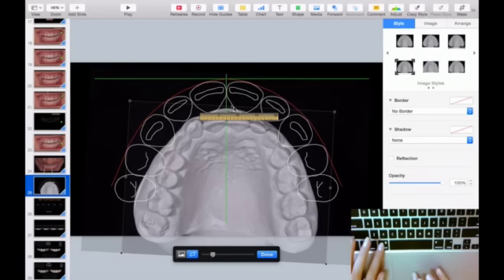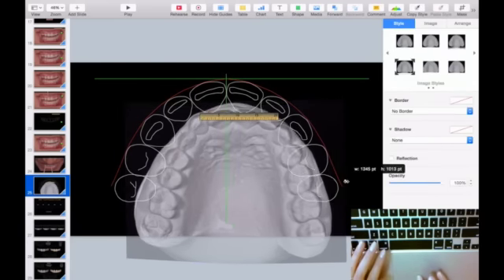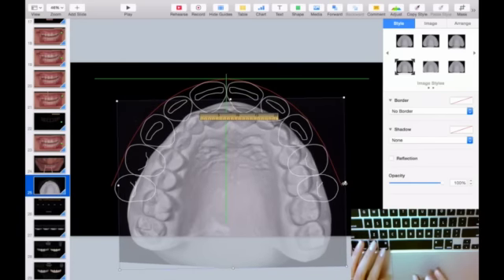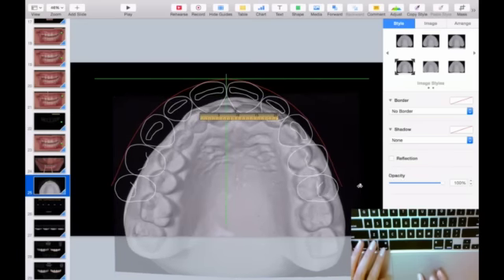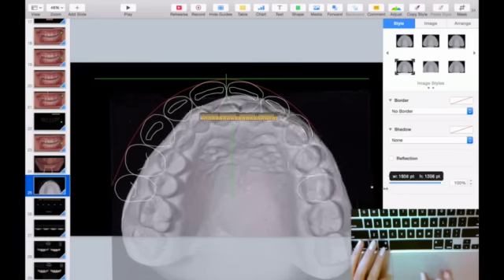If it bothers you again, make it straighter. And we make the picture bigger to make sure it's 16, and we have everything calibrated and nice to have the correct positioning and study of the case.